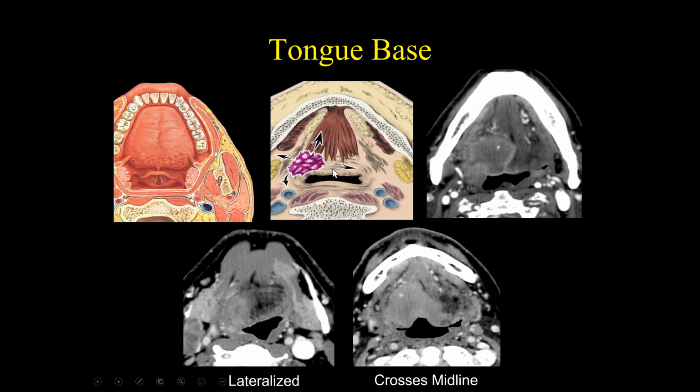The schematic illustration demonstrates a lateralized tongue-base carcinoma, but nicely illustrates the junction between the genioglossus and geniohyoid muscles and the tongue base. Oftentimes, it can be challenging to identify where the posterior aspect of the floor of mouth ends and the tongue base begins, and this schematic illustration identifies this. On the right-hand side, we can see the genioglossus muscle anteriorly extending posteriorly, and now it transitions into these horizontally shaped tongue base muscle fibers, and that identifies the tongue base. So in the top right-hand corner, we can see this lateralized right tongue-base carcinoma.